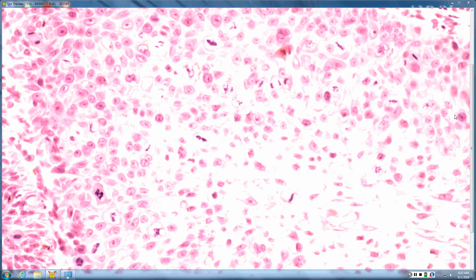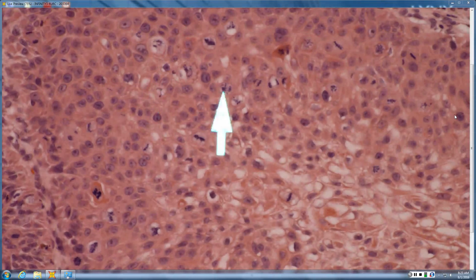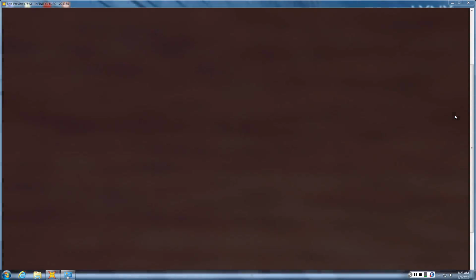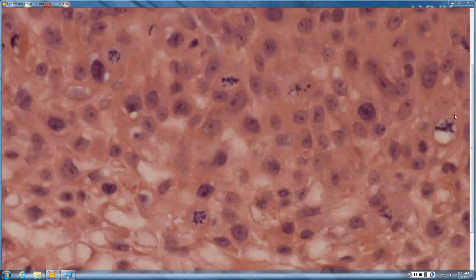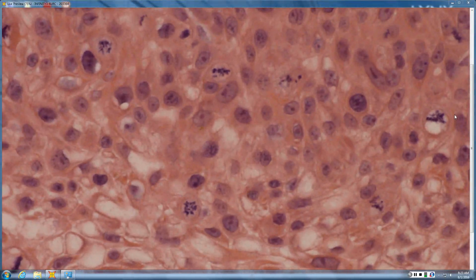So to judge that, number of mitoses we know doesn't really help. Atypical mitoses does help. And then you want to look at the nuclear envelope to see are there areas where it tends to be refractile and notched. Can you make out V notching? Yes, there's notching. There's V notching. So that would be more real squamous epithelial atypia.